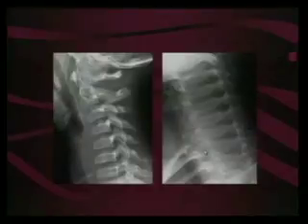That one's off a little bit. This is a little kid, so she shouldn't have any abnormality like that. If she were my age and you saw an articular mass like that that's off a little bit, then you'd probably think, oh, well, there's probably some degenerative change there. But this is a child, so she shouldn't have anything like that at all. So this was what was missed.